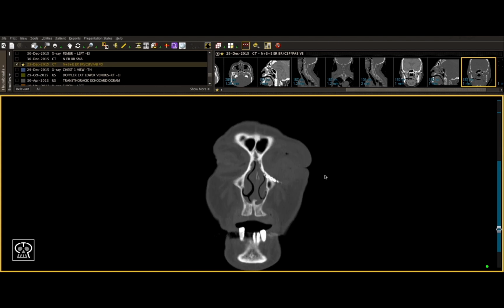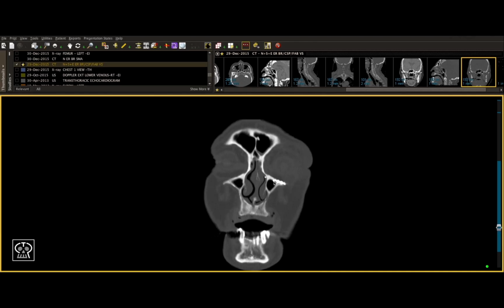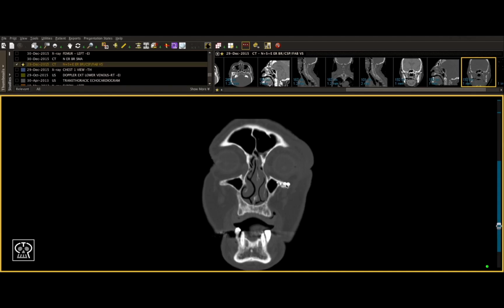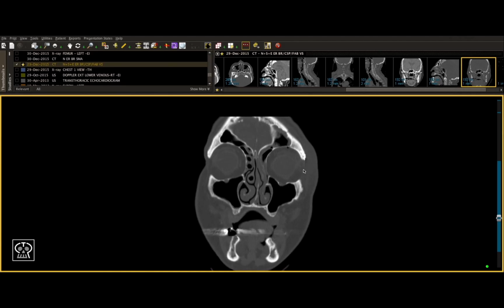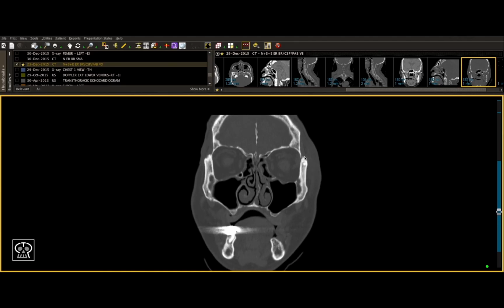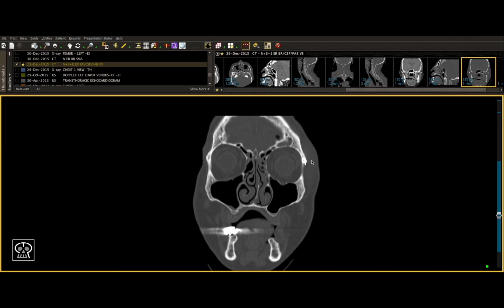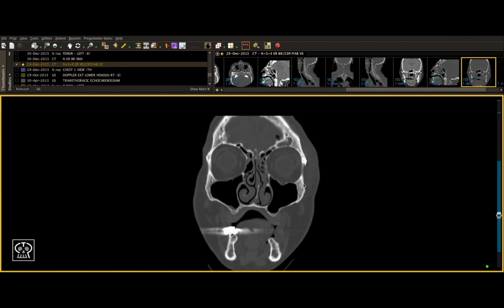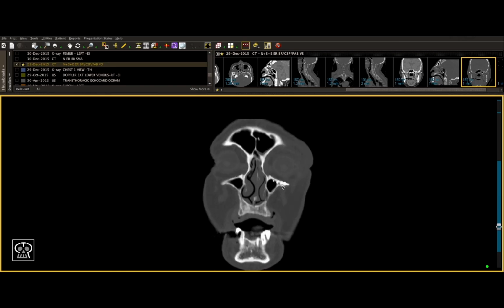The most radiopaque thing you can see on a CT scan is metal, and that's what we're seeing here at the inferior orbital rim. This indicates previous fractures and surgery of the face. You can also see it here. This one is spanning the ZF suture, indicating likely a previous left ZMC fracture, but we'll go into that in more detail in the ZMC module.